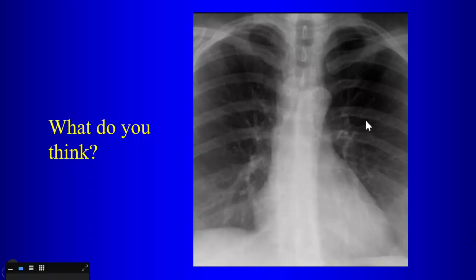So, what's going on? So what is this guy? That's a left aortic arch, so that causes a normal indentation on the trachea, so you would expect that. But what's causing the indentation on the right? Vascular ring. Yeah, from what? There's an opacity here in the right paratracheal region. Right? So what does this patient have? The double arch. This is a double aortic arch.